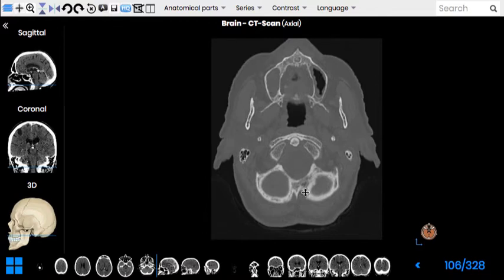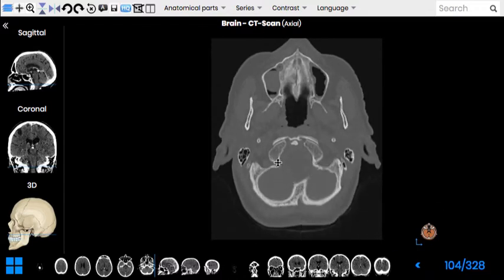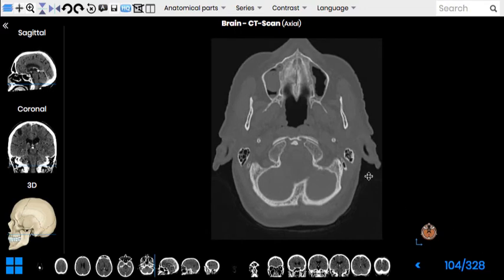And these whitish tissues which you see belong to the occipital bone with a big foramen in the middle, which is the foramen magnum. On both sides of the foramen magnum, you can see two oval-shaped structures. They are condyles. And condyles, as you know, articulate with the lateral masses of the atlas. So the next bone which appears just below here is the anterior arch of the atlas.